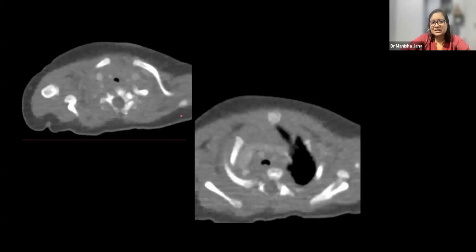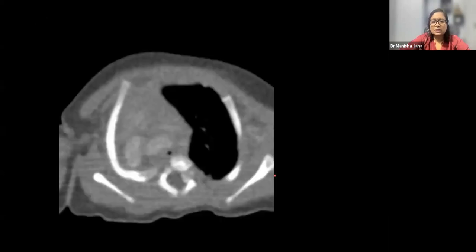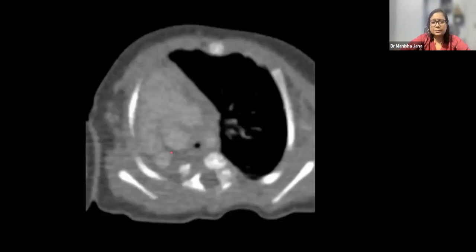So this was a CT. I am just showing the relevant sections. This is the trachea. Subsequently, a little lower down, we can see the trachea is becoming roundish, like an O. Now this is abnormal. This happens only when the posterior wall of the trachea is also surrounded by a cartilaginous ring. Normally the posterior wall is membranous, that's why it is flattened. So here the trachea is narrowed and becoming round. We can see the narrowing over here.